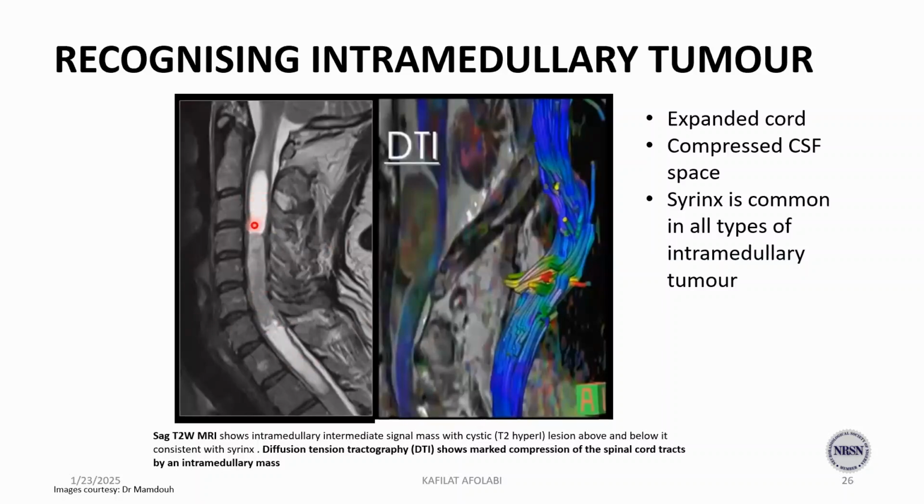I don't know if anyone is already, maybe some people may already be thinking what this particular lesion is.